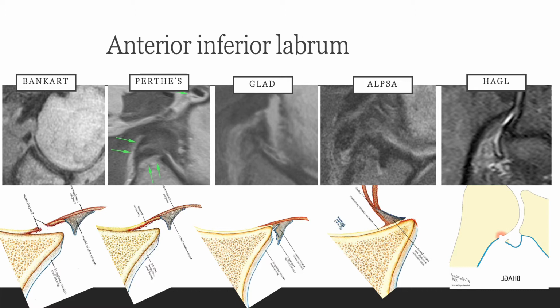If we look towards another alternative that can happen, you can see that the labrum comes off, the periosteum strips off, but there is no fracture of the periosteum, and so here you can see this labrum here, you can see the tear, and you can see this periosteum lifted off, whereas this black line is the cortex of the glenoid, and this is called a Perthes lesion. And some people like to break the periosteum and then fix this back so that healing is better. The presence of the periosteum being there can lead to a hindrance in healing.